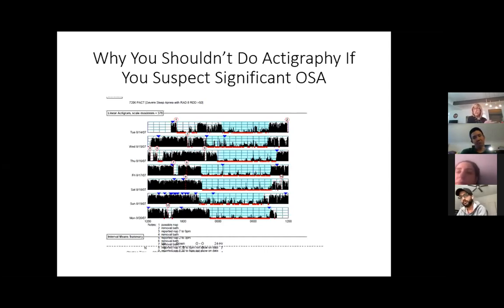I think the sensitivity is too high on this one. I probably would have cranked it down because almost hitting the top here. So this looks a little bit off, but when you've got bad OSA and you keep waking up and moving from snoring, so that's probably REM, and the movements of bad OSA. That's why you don't want to rely on it, because it looks like he didn't sleep at all. He probably did sleep, not very well, but that's what OSA looks like on an actigraph.